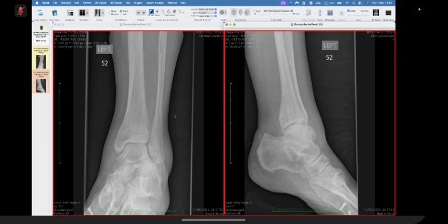Okay. Maybe there is a stress fracture seen in the calcaneus body, as this line of sclerosis. If you're talking about this line of sclerosis, that's just the sustentaculum tali. Okay, that's fine. There's no coalition either, by the way.